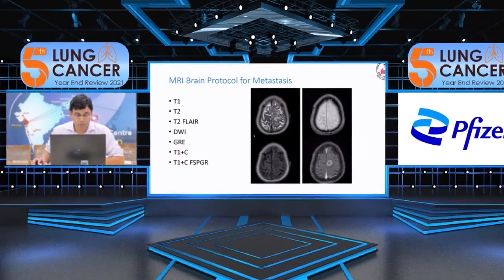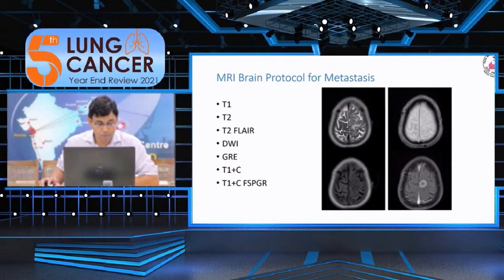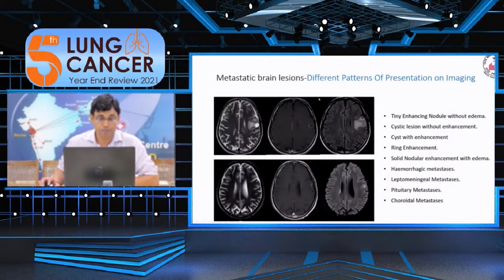They will help you distinguish brain metastasis from primary brain lesions, benign conditions, and sometimes chronic conditions like chronic ischemic changes. If you see this lesion, this is a solid lesion, very well marginated. The area that you see on the right is the edema, and then you will see that it is having an enhancement. So this is a classical presentation of metastasis. It is not showing any other features like hemorrhage in this particular patient.